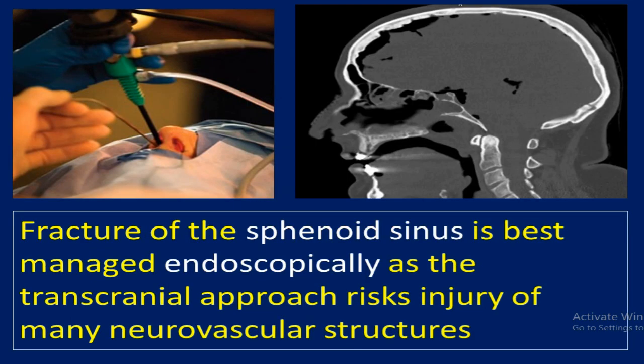Fracture of the sphenoid sinus is best managed endoscopically, as the transcranial approach risks injury of many neurovascular structures.